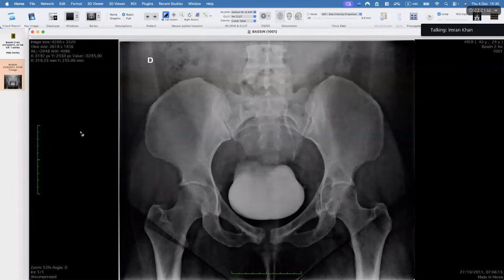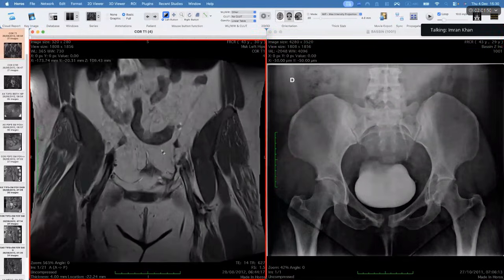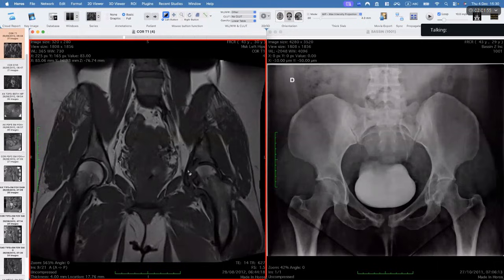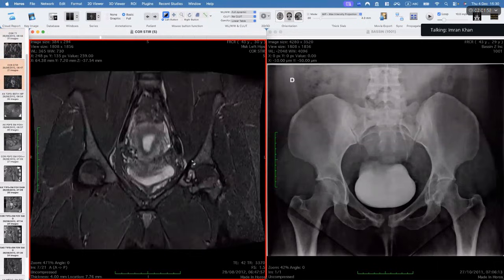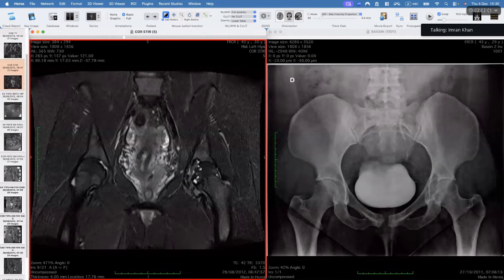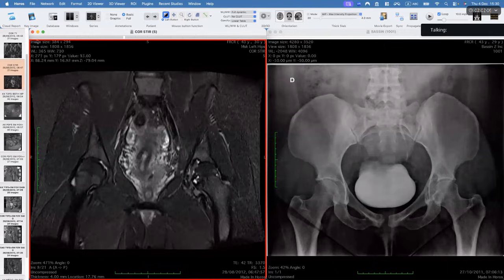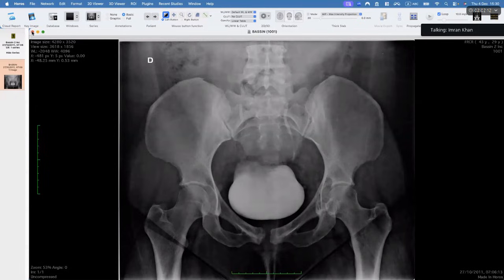So what is it? Pigmented villonodular synovitis? Correct. This is PVNS, okay? You can clearly see the same findings involving the femoral head and the acetabulum. So if you see erosions at the joint with preservation of the joint surfaces till the end, eventually it will collapse, but that occurs very late in the disease. So that is PVNS.